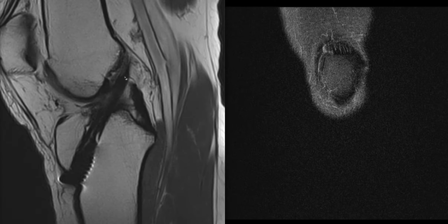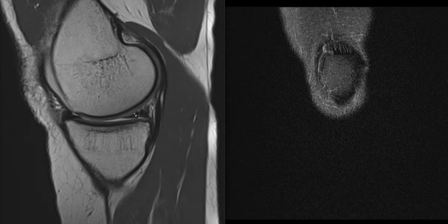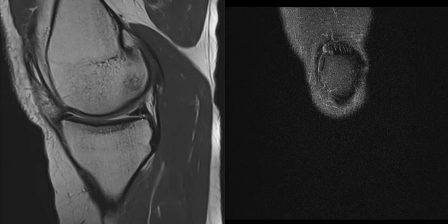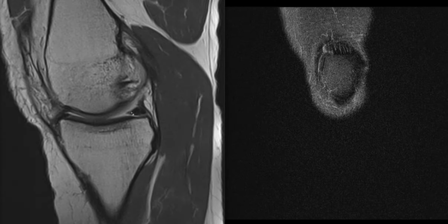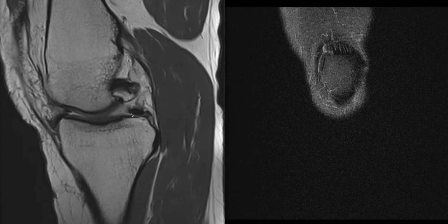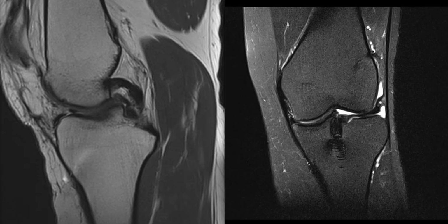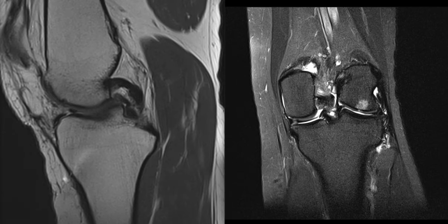This patient has had an anterior cruciate ligament reconstruction, and we can see a nice intact graft here. We can see that they've had a longitudinal tear of the posterior part of the medial meniscus. But as we scroll centrally, we can see that there is an abnormality at the rim of the meniscus, and as we scan further, we can see that there's a fragment of meniscal tissue that has been displaced posteriorly into the notch. And this is one of the characteristic places for meniscal flaps to displace to. So this is one of the areas that one must look very carefully to find displaced flaps.